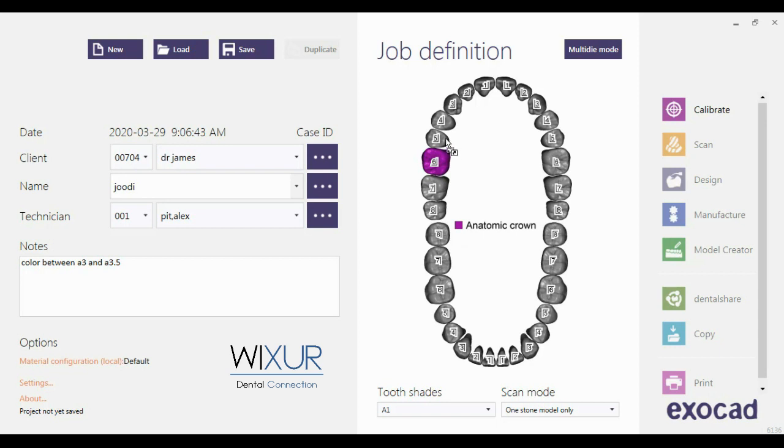In order to select another piece, I here use the drag and drop option. Also, you can use shift button on the keyboard and select on another piece from 6 to 6. And all the teeth from the same type of restoration are chosen. You can select and deselect them. Just play with them, it's not really hard, it's really easy. And the black dots here that you see are in order to make the single teeth to bridges, change them to the bridge. Now I have a single tooth and a 3-unit bridge.